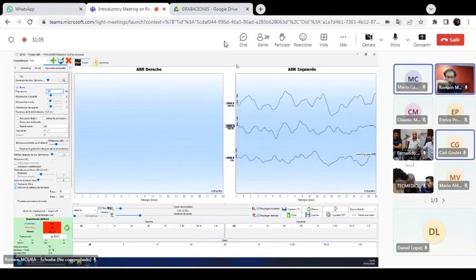I don't think there's any specific requirement for these devices to perform audiometry tests as well. Yes, the unit is capable of doing it, but correct me if I'm wrong, I think these options are not needed in this specific unit. That's why they're not enabled.